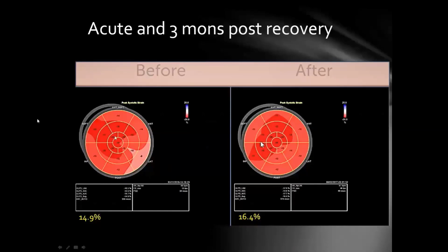And again, you see the more robust areas, they had a marked lateral hypokinesis with the inflammation, which we noted on the other echo. And then later, the GLS wasn't horrendously improved, but certainly better. But you do see the improvement here in the amount of strain. So if there's a way to do some of these measurements in patients with myocarditis, there's probably value there.